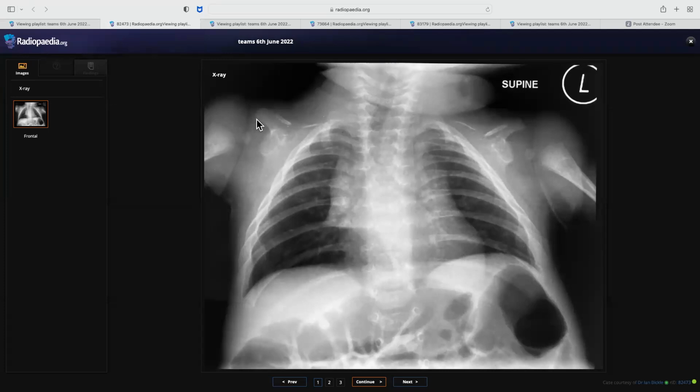Yes, cleidocranial dysostosis. Sometimes it happens when the first case is like that, maybe that carries on in the other cases also. So see, now you will never miss a case with absent clavicles.